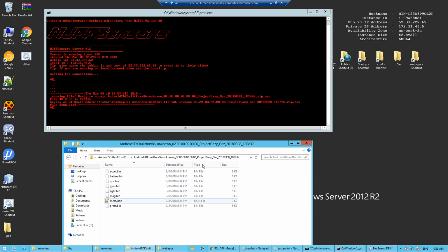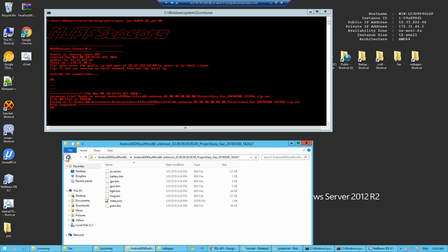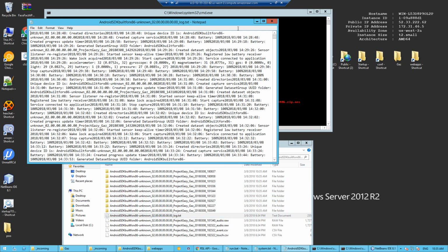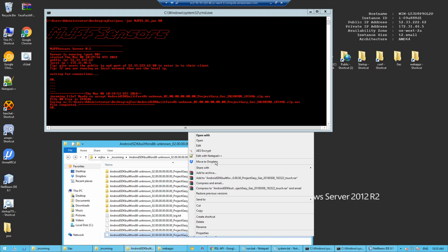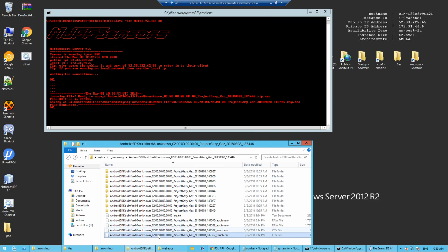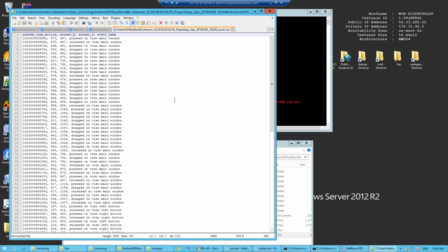Just the bin files and the meta, and they came over the socket to my little server here, encrypted and then got decrypted, and there's the log file and everything, and that was it. It all worked. I'll just have a quick look at this. They don't look very good in that text editor, but if you open them in Notepad++, they look proper.